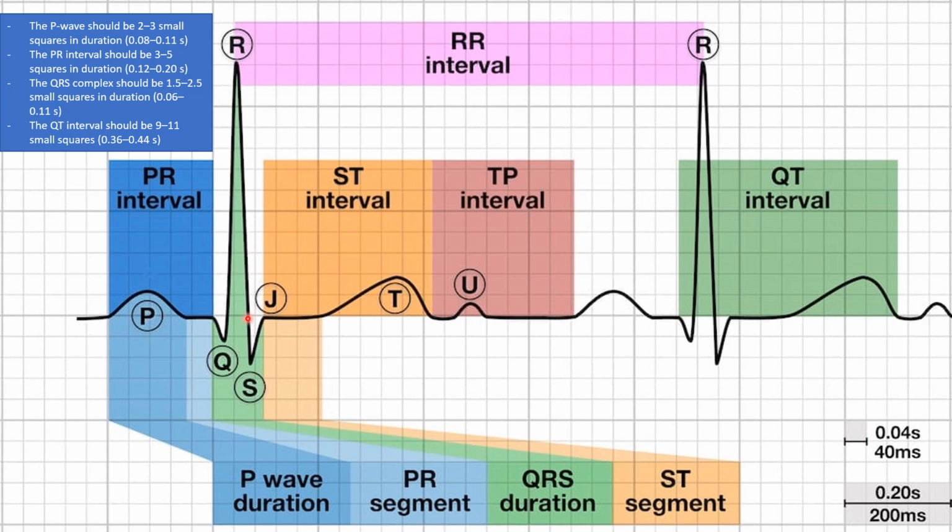Another segment that is important to know about is the QT, from the Q until the end of the T, where you see the downslope of the T wave crossing the isoelectric line. That's where you measure the QT, and then you can use some formulas to calculate the QTc, so you correlate it to the frequency of the ECG. We'll talk about that later. All right.